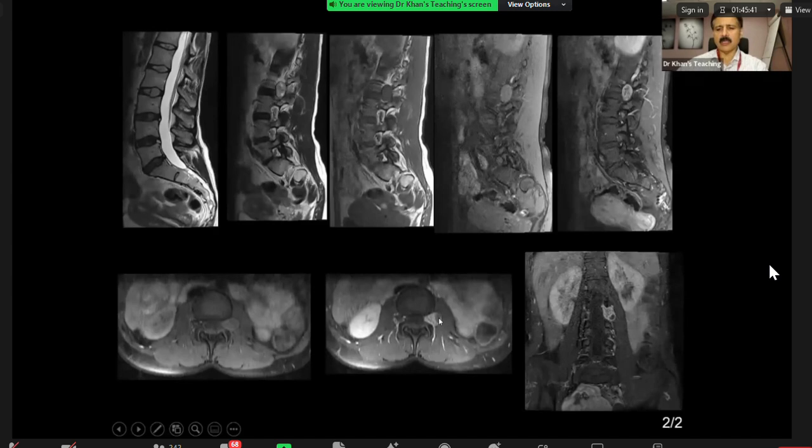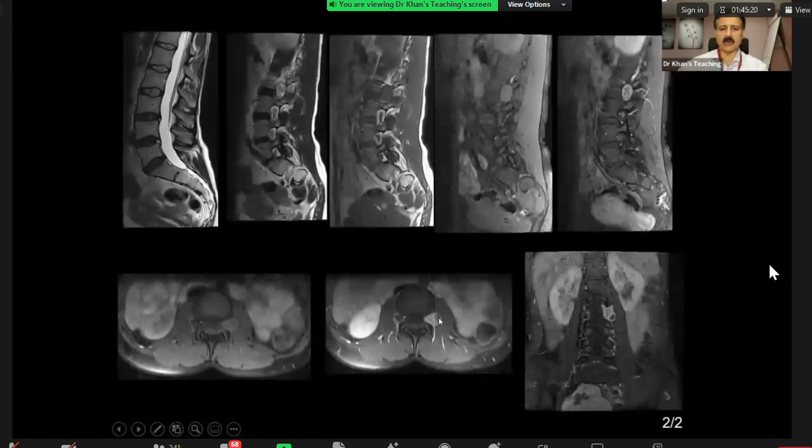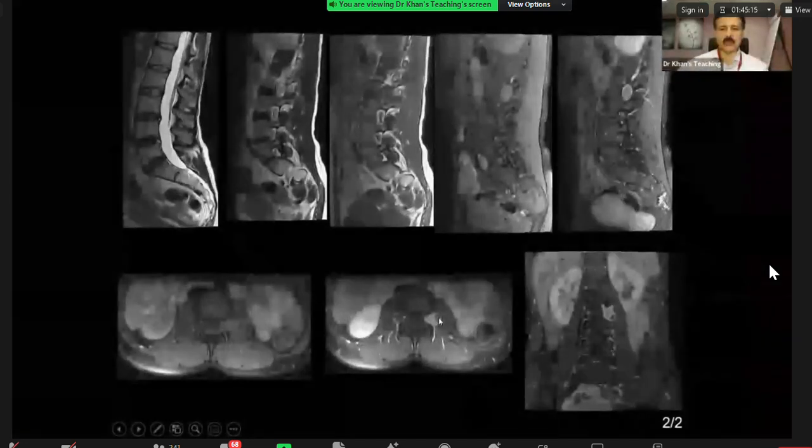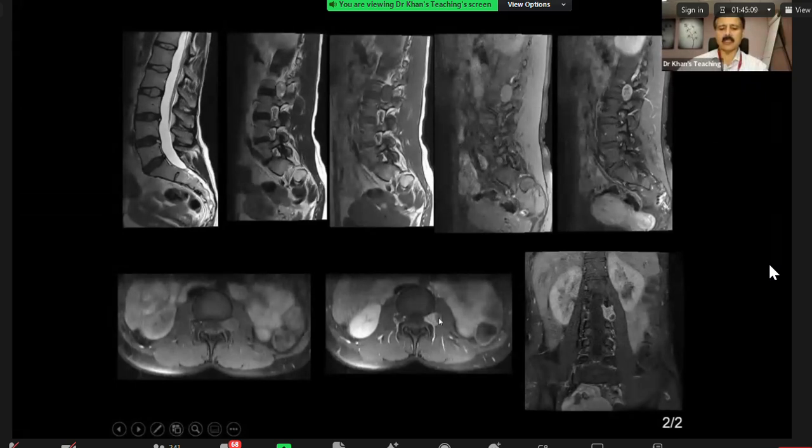You remember that I'm going into the world of CP angle tumors here in the brain. When you see a CP angle tumor, schwannoma versus meningioma, you remember I told you various discriminators. And of course, one of the discriminators is that meningioma can have calcification. It can cause hyperostosis of the skull if it goes in. Usually schwannomas will go into the IAM, but another discriminator is cystic component. Schwannomas can have cystic component in the CP angle, but meningiomas will not.